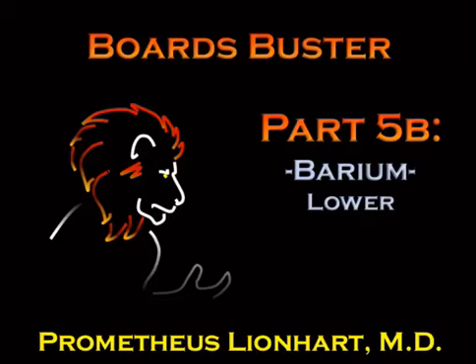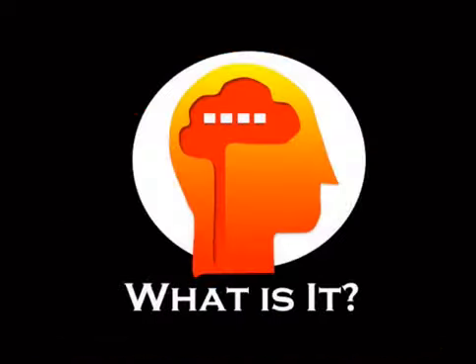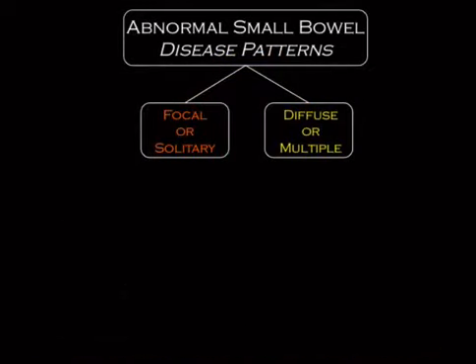Okay, so this is part 2 of the barium series, and this is going to be a talk that focuses primarily on pathologies that occur below the stomach. So I'm going to discuss a systematic approach for looking at abnormal small bowel findings on barium, specifically with diffuse or multiple findings.